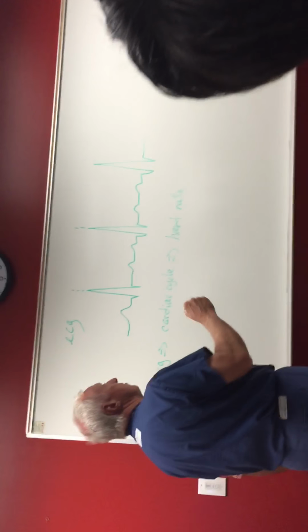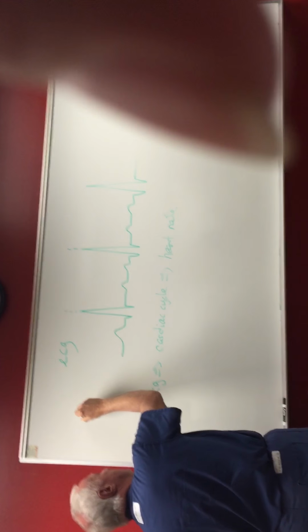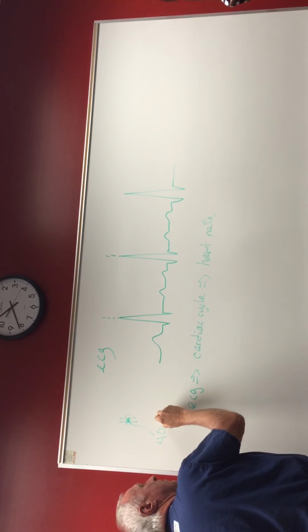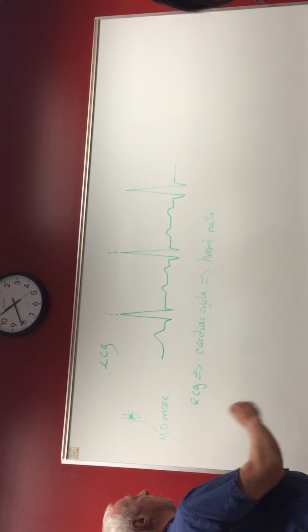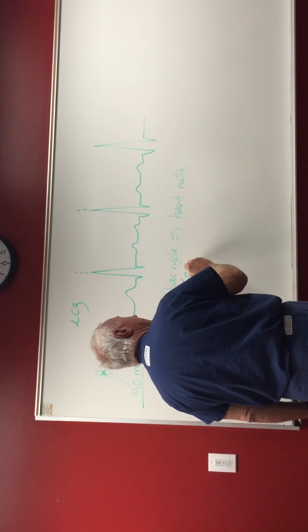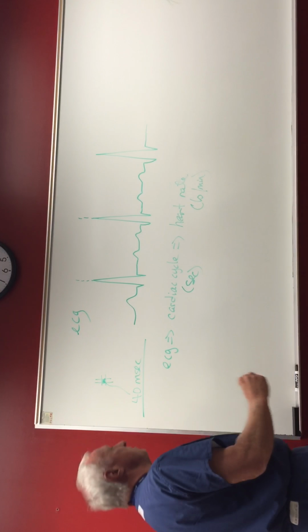Okay, so when you're looking at these little grids, the ECG is always going to be on little grids. Traditionally, each of these tiny squares is standardized so that each square is equal to 40 milliseconds. Now, an alternate way of putting that: because the cardiac cycle is always given in terms of seconds, and heart rate is in terms of beats per minute, there'll be some conversions.